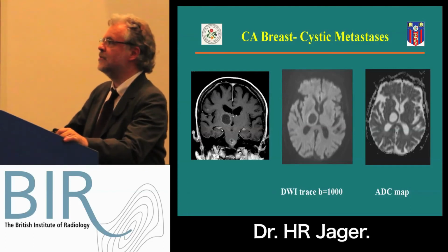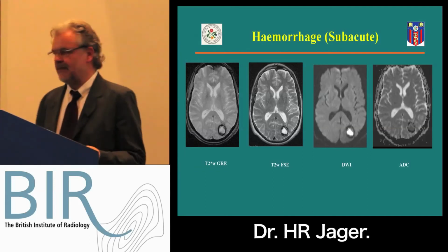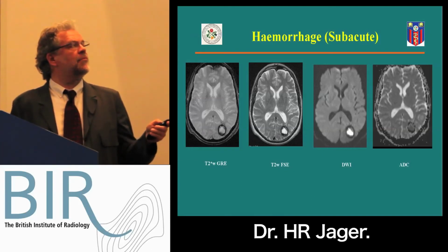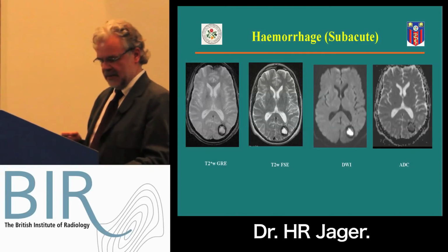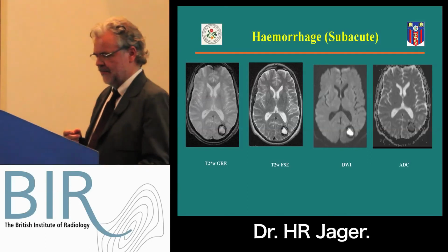A word of caution, hemorrhage can also be bright on diffusion-weighted imaging. And maybe Justine is going to say something later on to that. But the characteristic here is you have a T2 star weighted, a gradient echo, and it has this hemosiderin ring. But the center can be reduced in ADC and can be bright. It's just whatever is thick, thick organizing hematoma, thick pus impedes the diffusion. And the giveaway here is the rim on the diffusion weighted imaging.